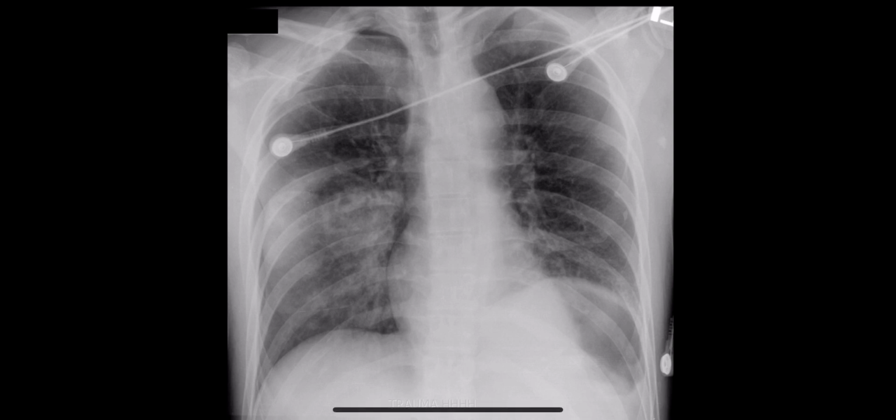In this patient who had severe trauma, we see multiple right-sided rib fractures with subpleural hematoma, and a large area of pulmonary contusion. The left hemidiaphragm is elevated, and that turned out to be a diaphragm herniation. And then more subtle, we see slight widening of the aortic arch, but really no widening of the right paratracheal region. And then this is an example of subtle but real depression of the left main bronchus.